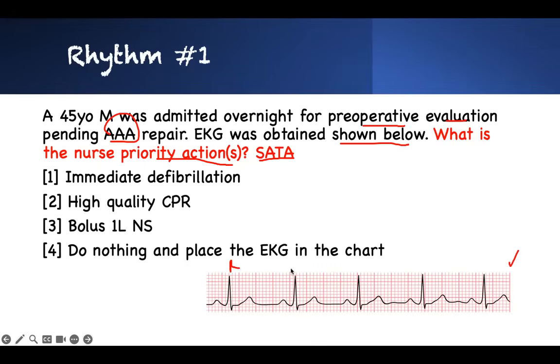You go through your RR, and just by looking at the RR, it looks normal. The distance 1, 2, 3, 1, 2, 3 is all normal, right? So I know this is a sinus rhythm. I calculate my heart rate. This is fine. You have 300 divided by 3. I see 1, 2, 3, maybe 4. Yeah, it's less than 100, right?